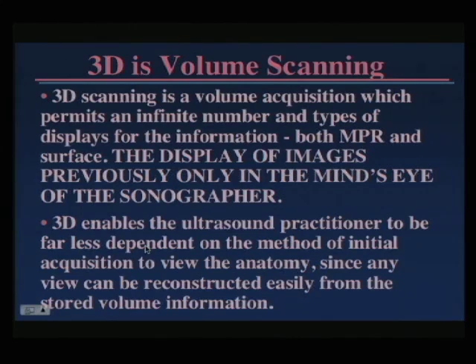So 3D is volume scanning, much like CT and MR. It's a volume acquisition that permits an infinite number of types of displays and certainly an infinite number of scan planes that you can display. And many of you can display these other planes in your mind's eye because, as a trained sonographer, as you scan in 2D, you reconstruct in 3D what you think is going on.